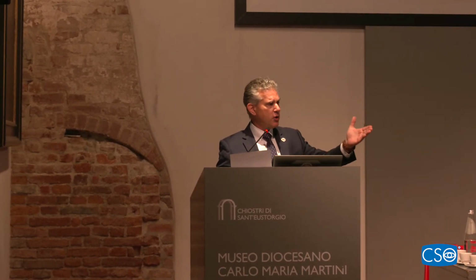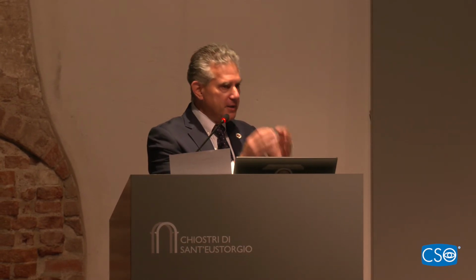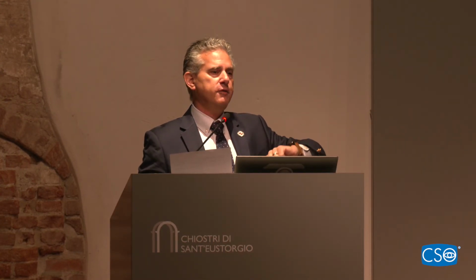The last thing I'm going to say is that it's interesting how this device, I think I saw a prototype probably in 2015. Of course, all the other OCT companies are starting to try to do topography and do the same thing now. But there's one advantage about this machine for me, which is that this company has been in topography for 30 years. So their knowledge base and their analytical capabilities in the software are so far developed that if you're a company starting to write topography software, you're starting from scratch. And so this machine for me is really the most powerful device that I have in my clinic.